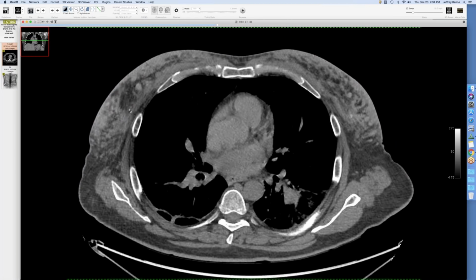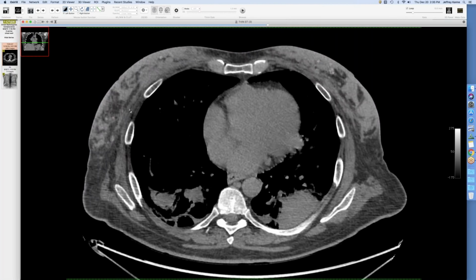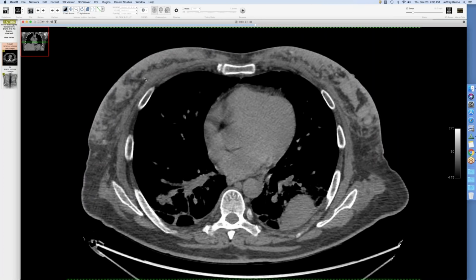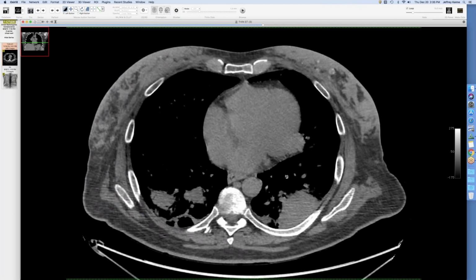So this is free silicone or silicone injections for cosmetic purposes. I know we've seen cases here from cosmetic surgery done elsewhere where these can get really bad and lumpy, and even see uptake in the axillary lymph nodes. But just in the chest wall here, it looks like they have an infection or something at this point, but that's not why I saved the case.